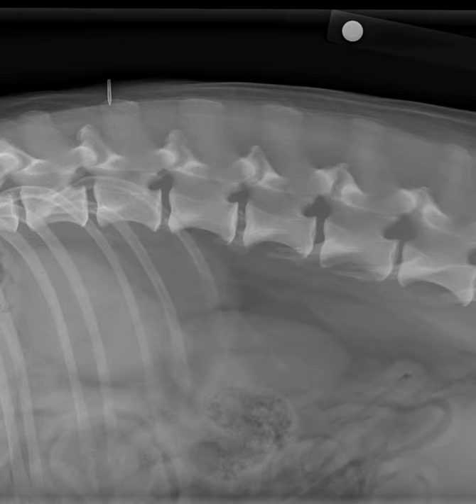The subroutine and sequential assessment that I do would include the following: disc space width and margination. So here I'd be looking at the disc space width, and margination would refer to how well defined these end plates are, which for me looks really normal in this case.